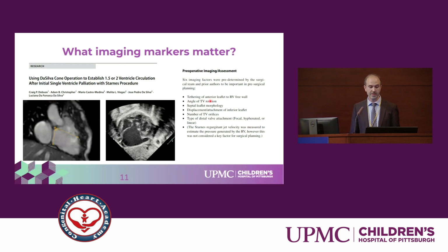These factors are if there is tethering of the anterior leaflet of the tricuspid valve to the RV wall, the angle of the tricuspid valve rotation that can be measured by echo or by cardiac MRI, as you can see here, the septal leaflet morphology, the displacement and attachment of the inferior leaflet, the number of the tricuspid valve orifices, the type of the distal valve attachments, whether it is focal, hyphenated, or linear, as Dr. Anderson mentioned this morning.